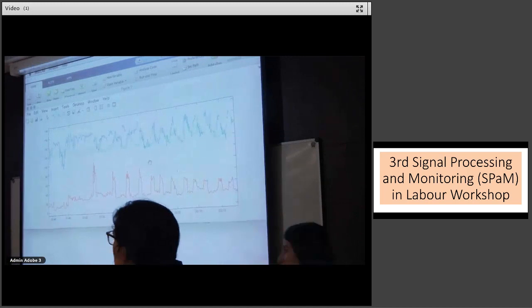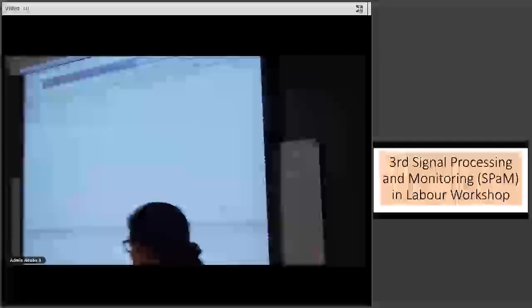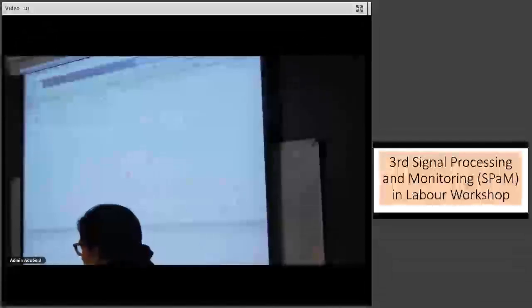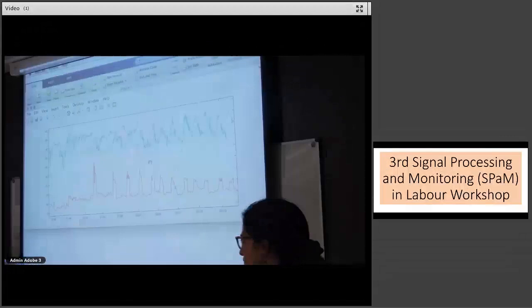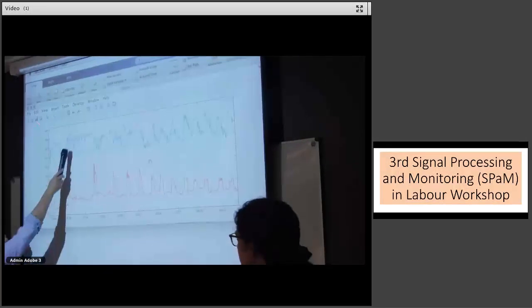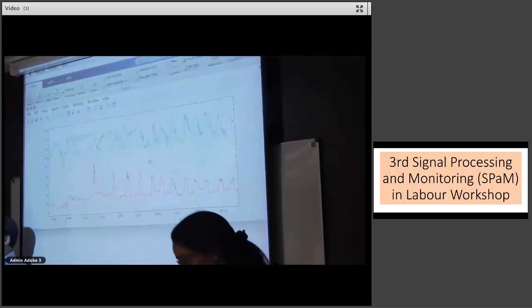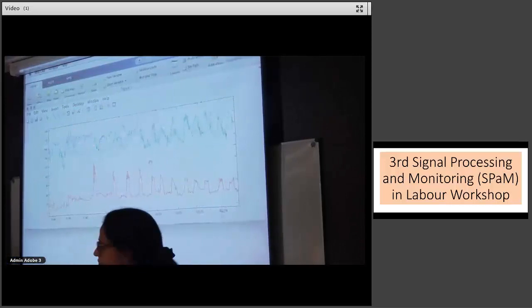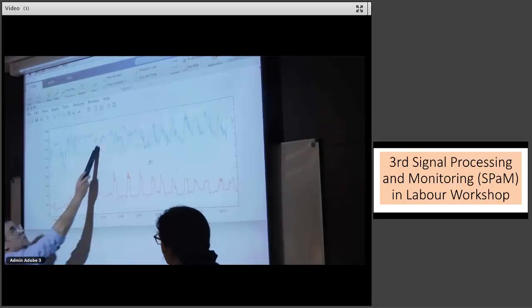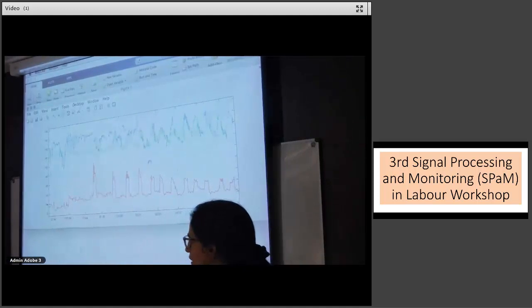The way we do it is we use this concept of the basal fetal heart rate. We don't actually show it because we think it's confusing for some clinicians, but it's there. And you can configure it to be seen. And if there are changes, we adapt the basal. We use the basal heart rate to adapt the baseline. So for instance, here there is no real baseline that you can identify. So we use the basal. Here, that would probably be the baseline. But there are many segments where you don't see any baseline at all. So we just carry on with the previous baseline. That's the way we do it.